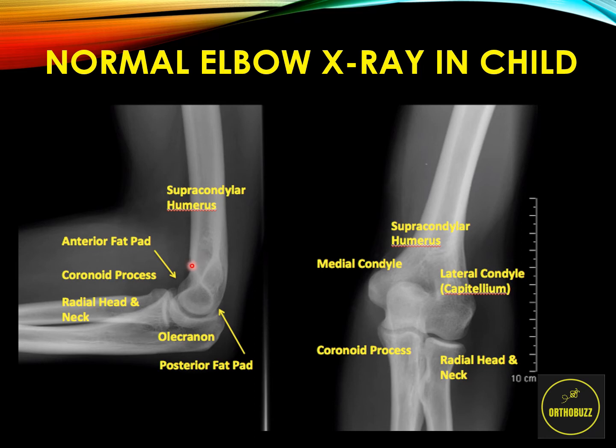Children who have elbow injuries and fractures may not always be apparent, and therefore we may have to look for not just bony signs but soft tissue signs as well. As we can see here, there's an anterior and a posterior fat pad which sit in the coronoid and the olecranon fossa respectively. If there's a fracture around there, sometimes we can get swelling and even some blood which goes into those fossae and can push the fat pad out. The different densities of blood and swelling fluid compared to the fat can give different soft tissue signs on the pediatric elbow.